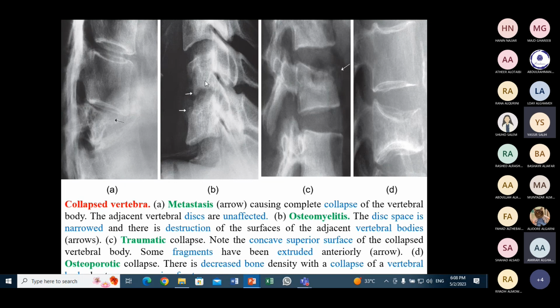In this one, this vertebral body is small, and you can look and see the intervertebral disc spaces is affected. The disc spaces is narrow. This area. لاحظ إنه compare this with this disc spaces is narrow. زي ما احنا قلنا الديسك spaces إذا كانت narrow in addition to small vertebral body, this goes with infection. So this is osteomyelitis أو الانفكشن in general. حتى البوتس disease يحبوا الديسك، يعني كان affecting the disc.